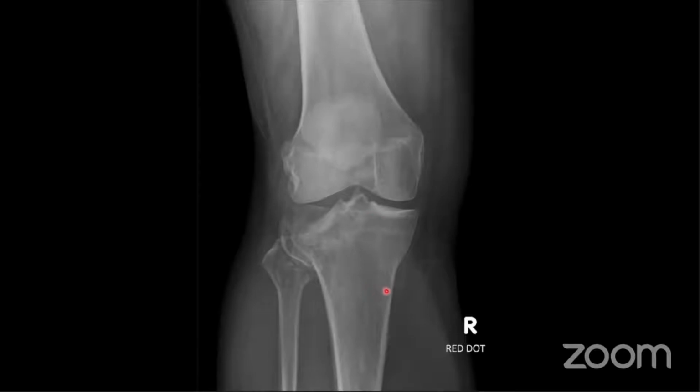So this is the normal trabecular pattern of the bone. So this side is normal. Whereas if you look at the underlying bone here, it's not a regular trabecular pattern all the way down. There are sort of denser bits and normal bits in between. So this means that there's disruption to the trabecular pattern, which implies there's a fracture.